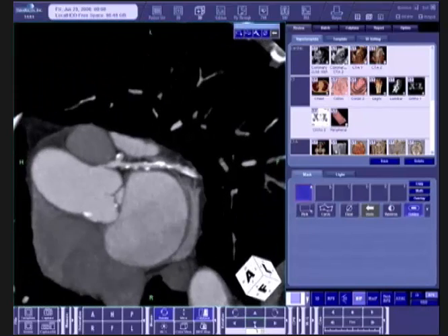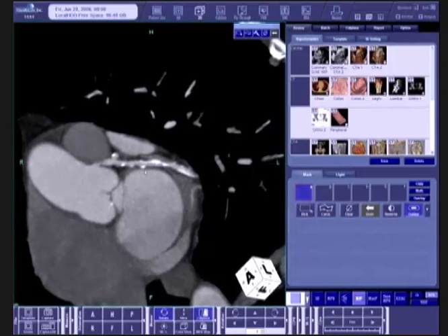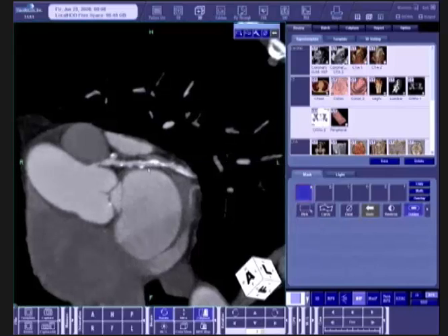You can see here as you follow this that this circumflex artery is patent, and in fact at least up to this point, if you were looking at the luminogram, that is the coronary arteriogram, you might actually say that this patient has no disease, or it looks relatively normal. In fact, with CT, we're able to appreciate the full thickness of the coronary arteries, and this patient still has relatively severe, complex plaque, but it is non-obstructive.